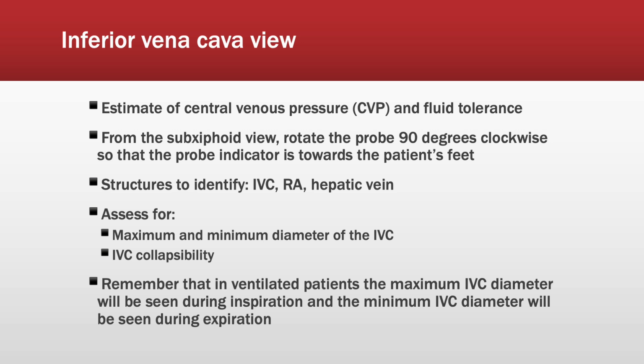Conversely, venous return decreases during expiration or exhalation, while the IVC diameter increases. To summarize, in spontaneously breathing patients, remember that the maximum IVC diameter will be during expiration and the minimum IVC diameter will be during inspiration.